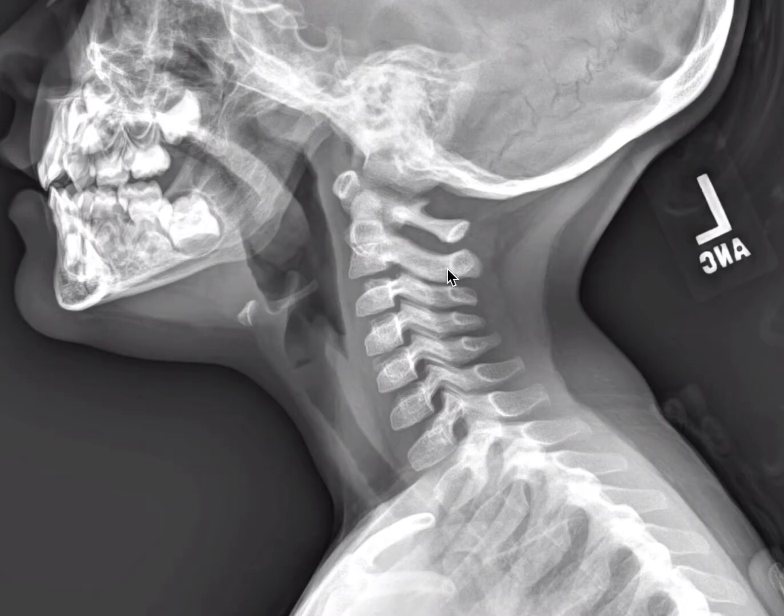This is allowed to be up to 2 millimeters anterior to the anterior aspect of the C2 posterior arch in children. This is allowable in children because their facet joints are more horizontally oriented and because they have greater joint laxity in general. The false impression of anterior subluxation of C2 on C3 may be simply from head positioning in a child in which the neck is too flexed.